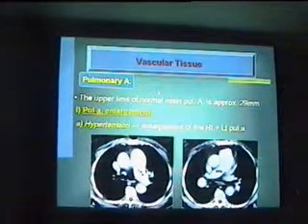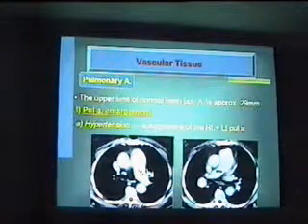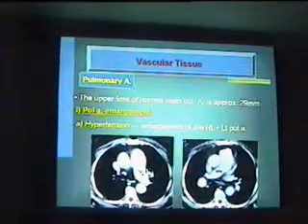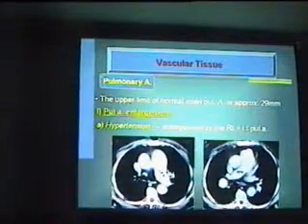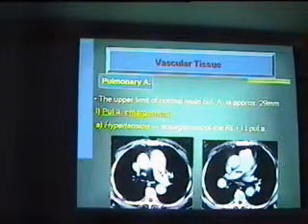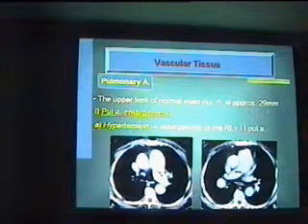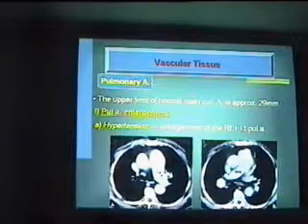عندي بقى إيه المشاكل اللي في البلمونري ارتري تطلع؟ البلمونري ارتري انلارجمنت، البلمونري ارتري نفسه يكبر. أشهر كوز للبلمونري ارتري انلارجمنت هو بالمونري هايبرتنشن، مش كده؟ بنلاقي انلارجمنت أوف ذا رايت اند أوف ذا ليفت بالمونري ارتري، وده الأسندنج أورتا وجنبيها المين بالمونري ارتري، and this is the left branch and this is the right branch. ألاقيهم enlargement لما أقيس المسافة دي.